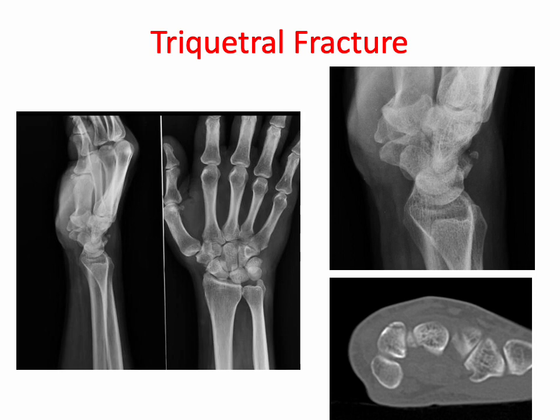So here we can see a fracture of the triquetrum here. Difficult to see on frontal projection, but more easily seen on lateral projection.